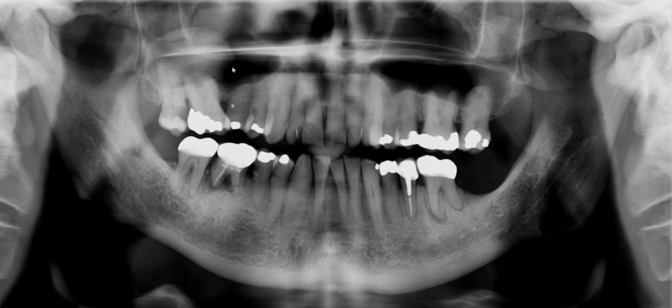This is a very, very classic representation of, hopefully all of you can say the answer, mucus retention pseudocyst. Again, this is mucus retention pseudocyst. So if you knew the answer, that's great. You did a great job, because faculty wanted to confirm this with me. So now let's take a look at the second area.